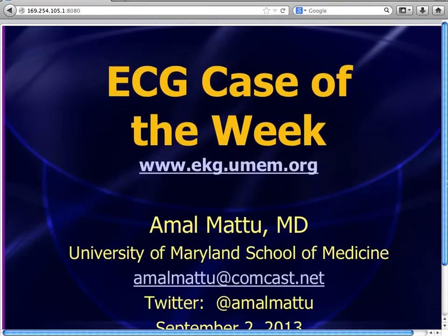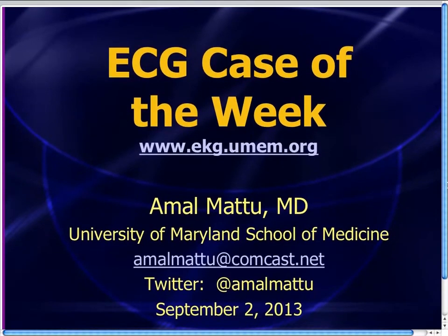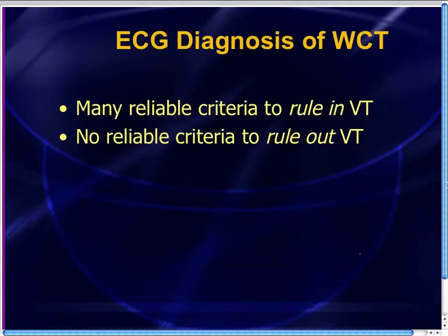Well, welcome everyone to the EKG case for the week of September 2nd, 2013. This is a bit of a continuation from last week's case where we were talking about wide complex tachycardias and trying to distinguish between SVT with bundle versus ventricular tachycardia.